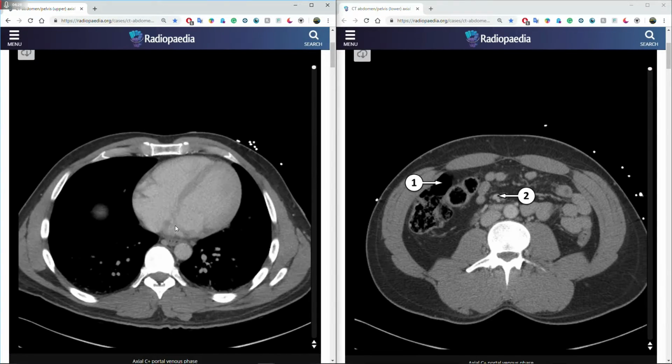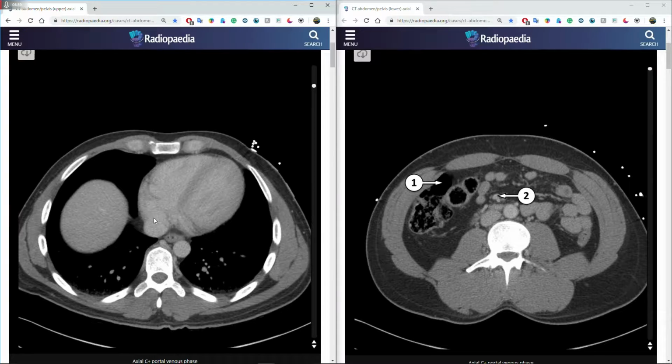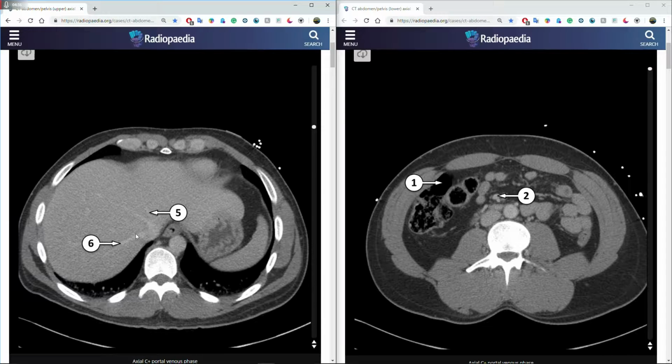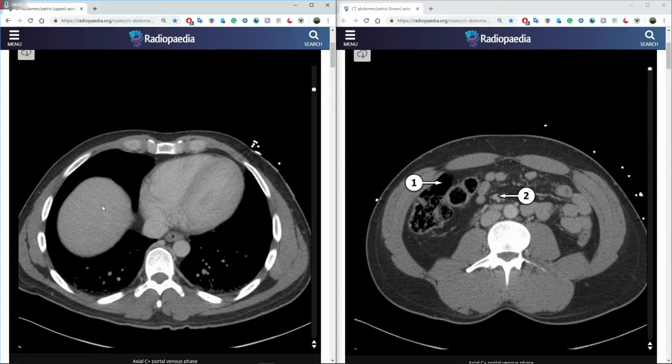We know that if we follow along with the right atrium, the superior vena cava, which runs through the right atrium, becomes the inferior vena cava. And we have the right hepatic vein, middle hepatic vein, and left hepatic vein. So they drain the blood from the liver back to the vena cava, while the hepatic portal vein system had brought blood into the liver.